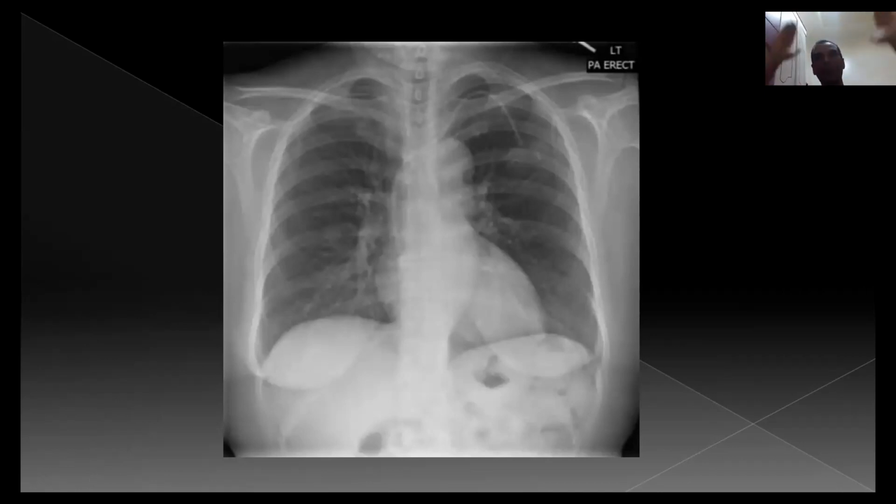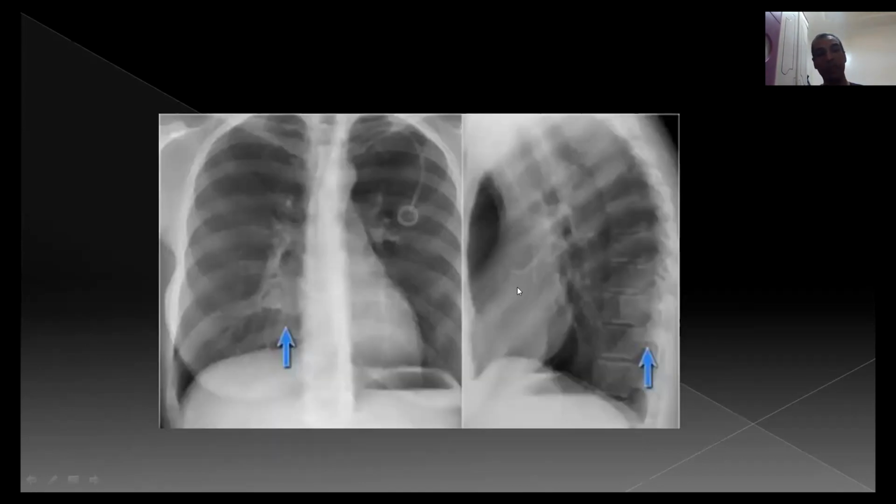We have the 3 pneumo, then we go to consolidation, cavitations, then nodules and masses. You should search for nodules in each part of the lung field. For example, here we have a pulmonary nodule, and also here, and here. Sometimes the pulmonary nodule can be hidden behind the hilum, like this one. All of this one, this is a mass, not a nodule, it's very large.